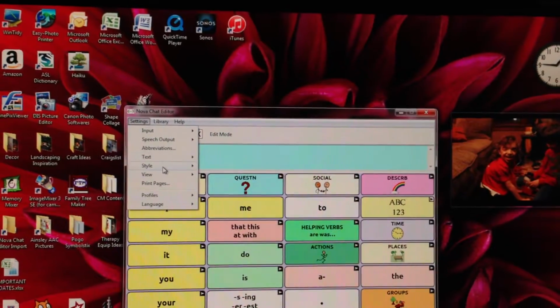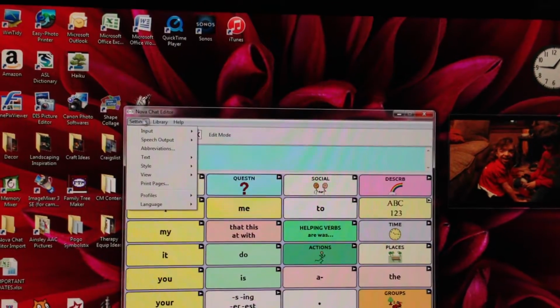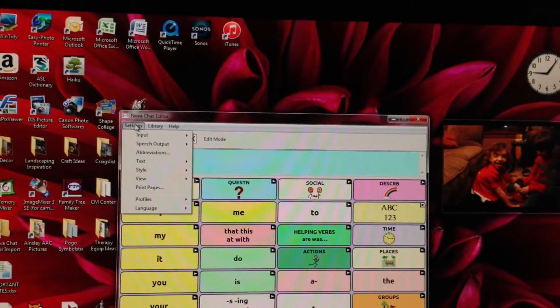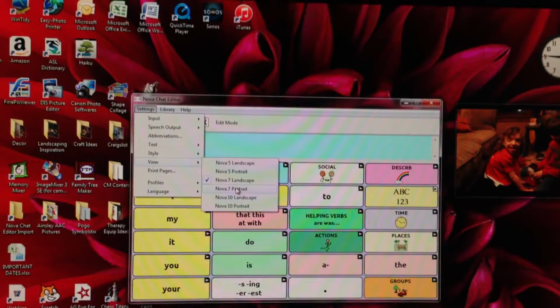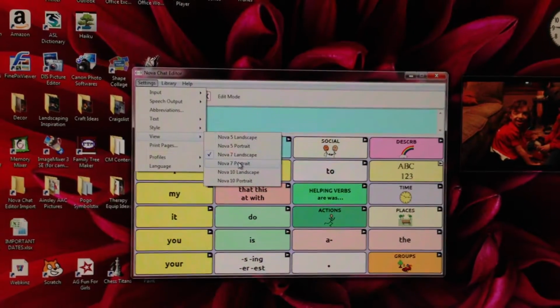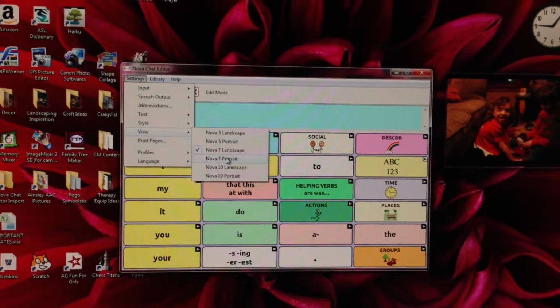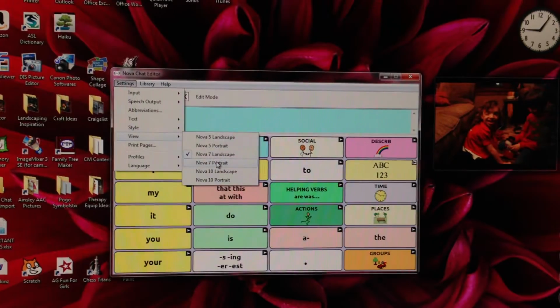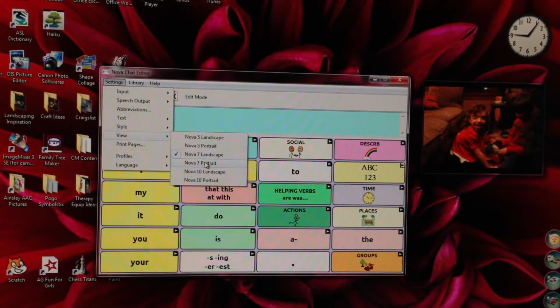you can change the orientation of the device. That requires, on the actual device itself, that you unscrew the amplifier and change the orientation. And that unfortunately does cause some issues. It doesn't work as well in portrait. You have to mount it upside down in order to not cover up the camera, which then means that when the device powers down and back up, it's upside down, and there's just some issues.